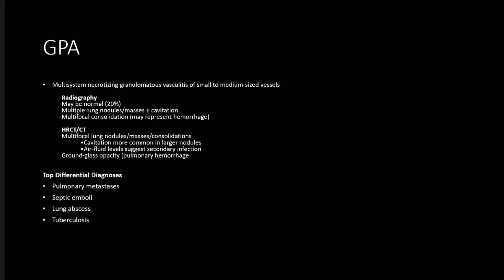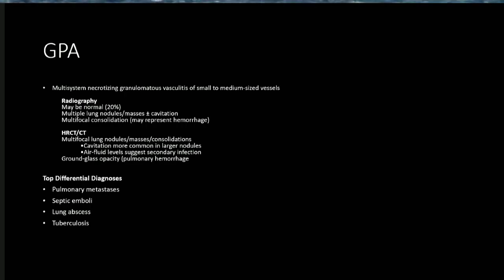Radiographs can be normal, or could show multiple lung nodules with masses, plus or minus cavitation. Honestly, this radiograph was reported as having a slight low opacity in the lateral radiograph that I showed you. So we said that it could be a cavitating lesion, but the differentials remain the same, just the way you said.